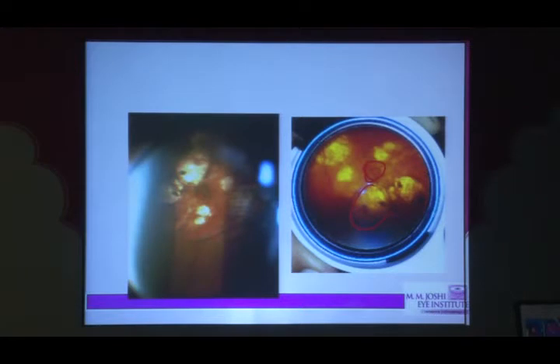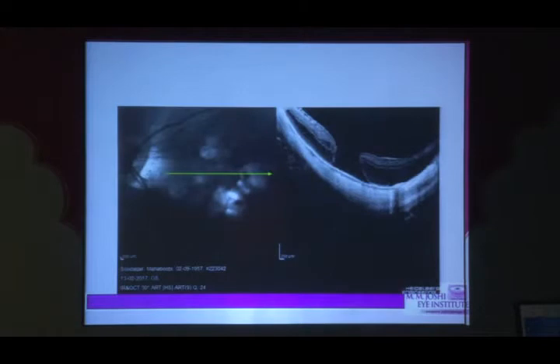Here is a case of high myopia. When I switched to 78D, I thought that looking at the IDO it could be a CNVM, myopic CNVM. But looking at the 78D, there were no subretinal hemorrhages or any vascular network there. Then I thought, okay, it could be a pigmentation. Anyhow, I told the patient to undergo OCT testing, which the patient was not agreeing to. Then after a lot of counseling, the patient did undergo OCT, and surprisingly, we found a macular hole in this patient.